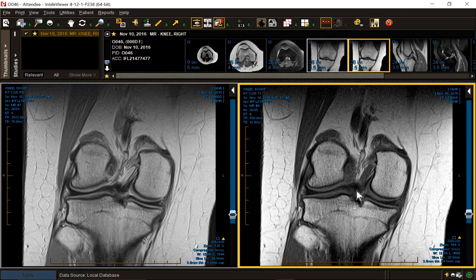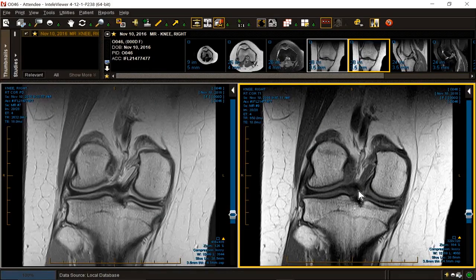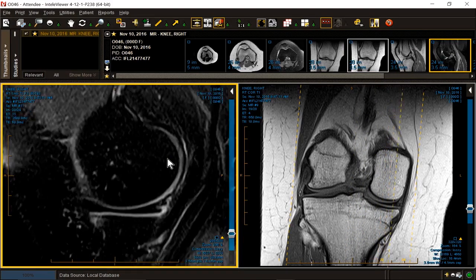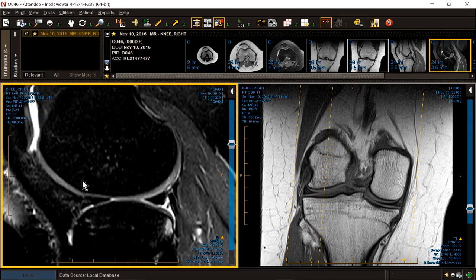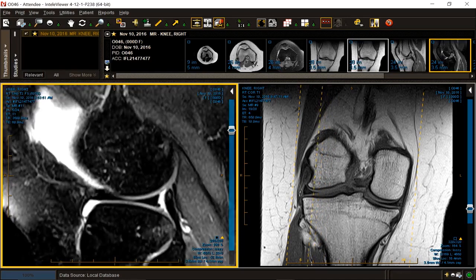So you can call this a functional full-thickness ACL tear or just an ACL transection. Either one works. Are we done? Of course not. We've had a pivot shift injury of some kind. Let's take a look at our skeleton for a moment and see if there are any supportive signs of such. There is. There's at least one component of the pivot shift in the back. We did not sustain a femoral terminal sulcus injury, but supportive information for our ACL tear.